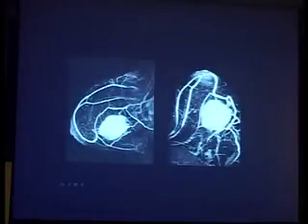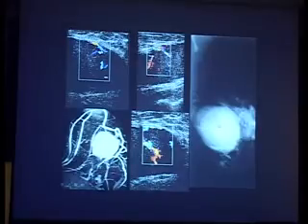Pre-GAD on the top left, post-GAD and delayed. Heterogeneous enhancement, perhaps homogeneous with some non-enhancing internal septations that filled in, type 1 persistent kinetics, oval mass, circumscribed, so we're still kind of thinking benign, but this is an AV fistula or AV malformation. I wish I had a video of the presentation, but I don't, but it really sounded like it was a palpable thrill. And here are her MRI images, in the sagittal and the axial, lots and lots of feeding arteries and draining veins, perhaps. Okay. Again, all the images put together, compiled now.